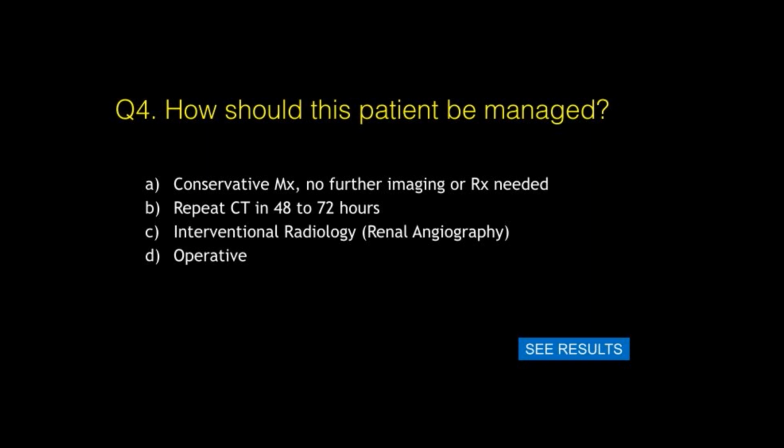So how should this patient be managed? I'd like you to vote now, please, and tell me. Same set of options: conservative management, repeat CT, interventional radiology, or operative management. You can vote now.